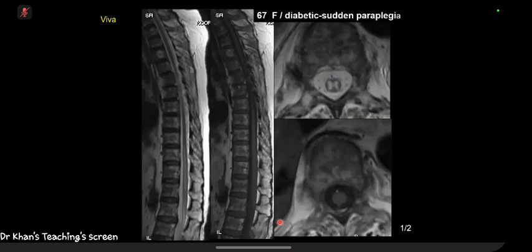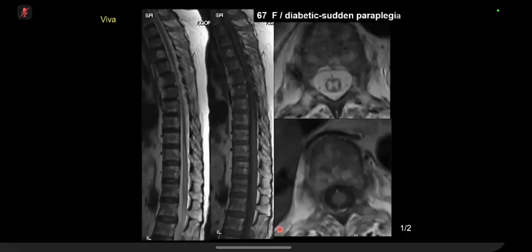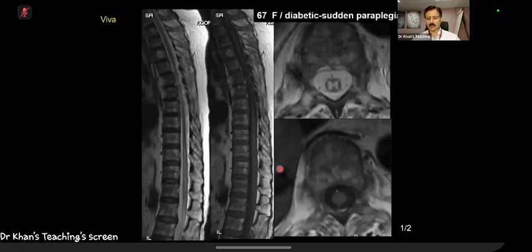You're going to be more likely to knock off your anterior spinal artery. And there's a hyperintensity. So what is your conclusion? Concerned that this patient has had a spinal infarct. Infarct, okay. So your conclusion is correct.